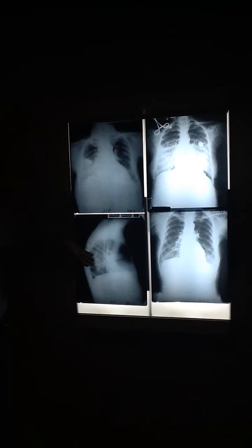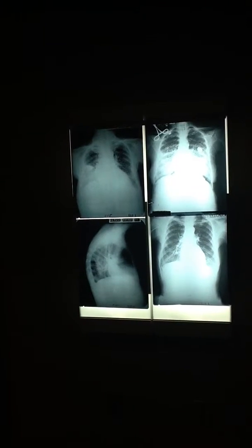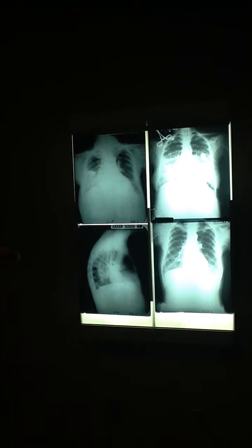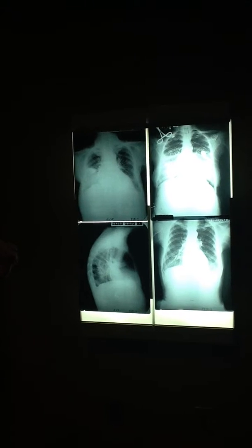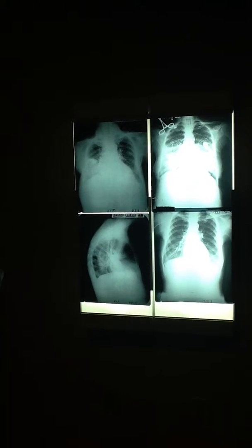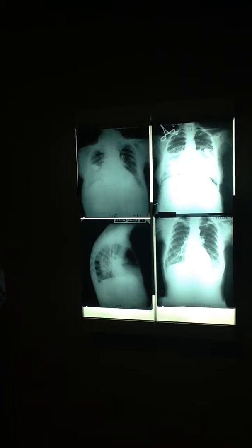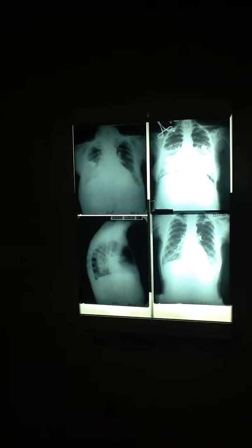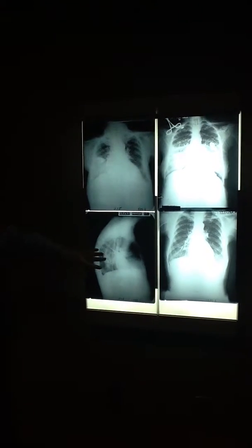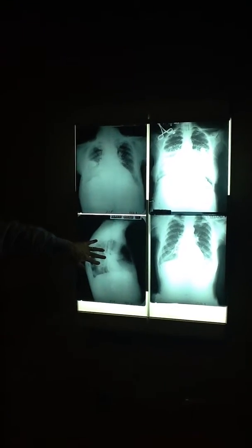The pleural effusion in this patient is accumulating between the layers of the fissures. So the fissures, which normally would be right up against each other like that, are being spread apart by the fluid like this. So it's what's called an interfissure effusion. It's atypical. That's a subpulmonic or infrapulmonic atypical. And this is interfissure effusion, also atypical. And mostly this happens in patients that have congestive heart failure.